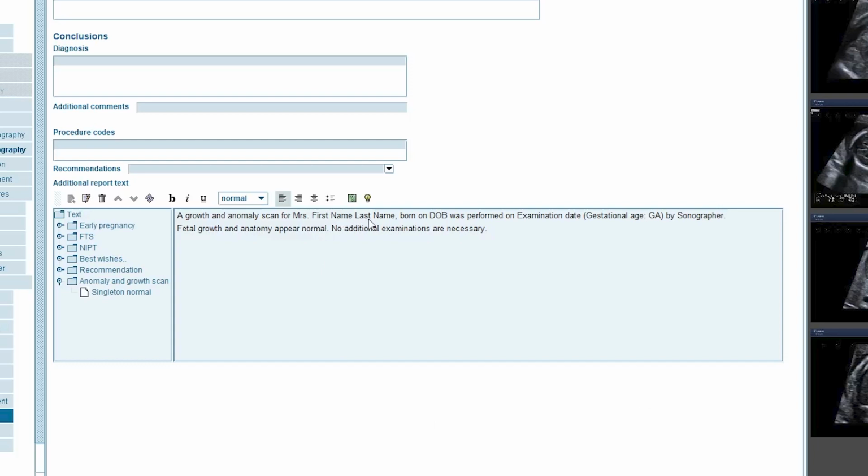As you have probably noticed, my text example contains placeholders for patient name, date of birth, etc. Of course, these are to be replaced for the final report with the patient and examination-specific data. This can be achieved with the help of variables. Variables are actually also a kind of placeholder, but they are defined by Astraia and therefore allow the automatic transfer of the information from the corresponding database field.